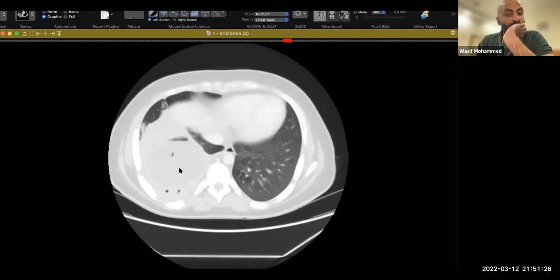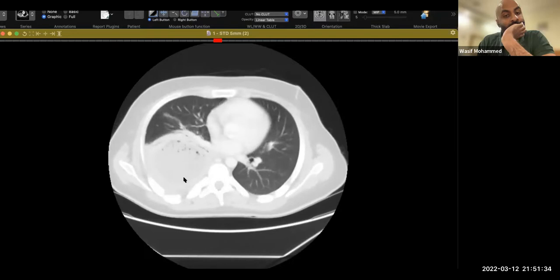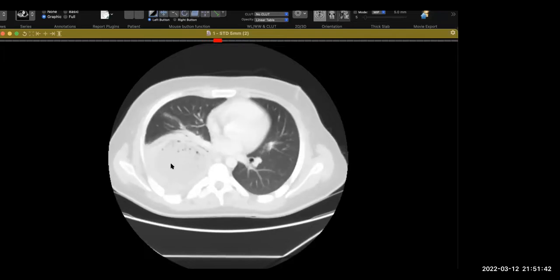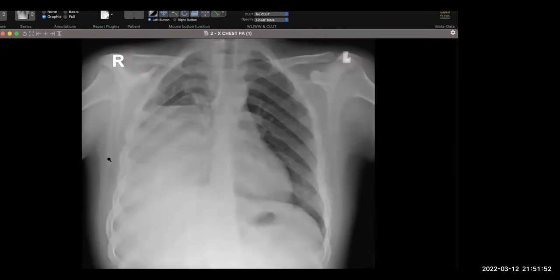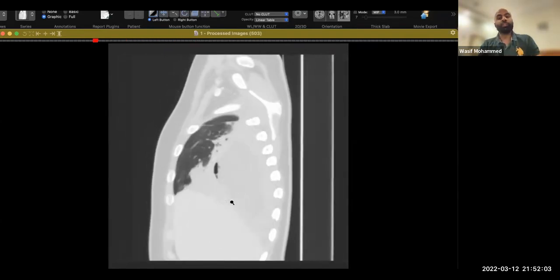Okay, bronchopleural fistula is a good thought when you see air in loculated empyemas, but this is not to the degree that you would see in a bronchopleural fistula. This mottled appearance is of necrotizing air-forming organisms. The previous X-ray was just for the patient. The patient just started out with consolidation. The antibiotic treatment was not proper. It progressed into this. And this is a CT for this patient. So involving the lower lobe, some part of the lower lobe is still spared, but most of it is necrosed and has turned into an abscess.